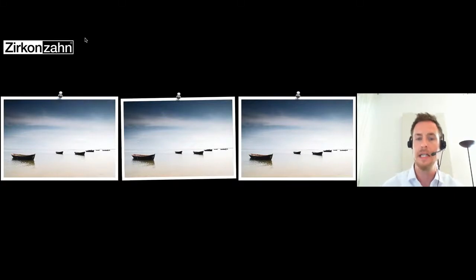To understand that better, I have an example here. You see immediately the middle picture is tilted by a few degrees. I will not tell you how much, but you think, okay, how many degrees is that? And I will say to you, it's not a lot. Just a small rotation, a small mistake during the registration with the FaceBow, has a huge effect on my restoration, aesthetically and functionally. As you can see, this picture is tilted just half a degree, and it seems like a lot.